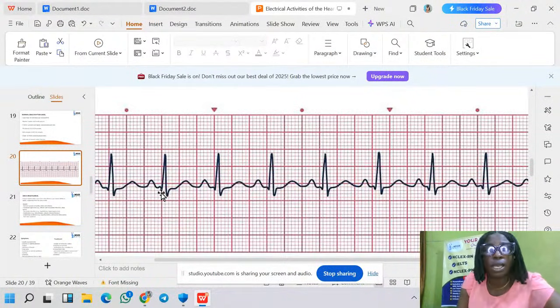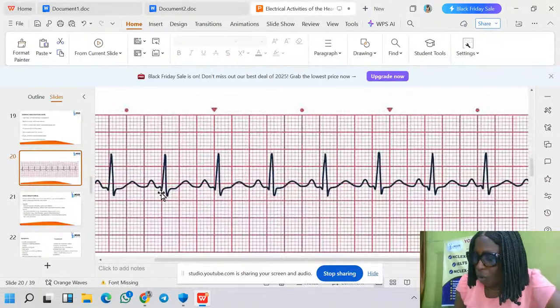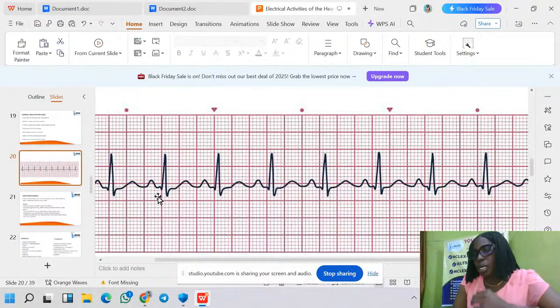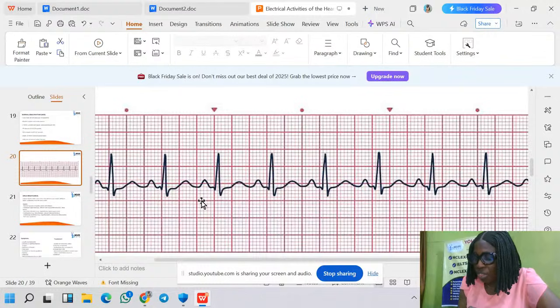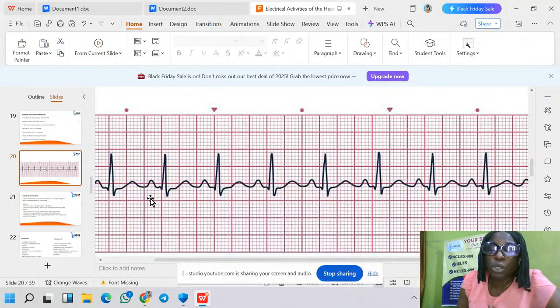Okay, you saw 4. What do you see at your end? Somebody has seen 4. 1, 2, 3, 4. I think she's right. It's actually 4. Thank you. It's 4, and we say the number should be 3 to 5. So having this 4 means that our P is good, our PR is good.